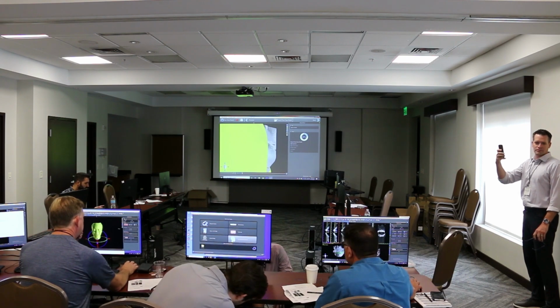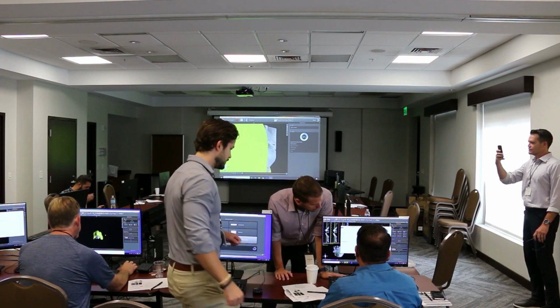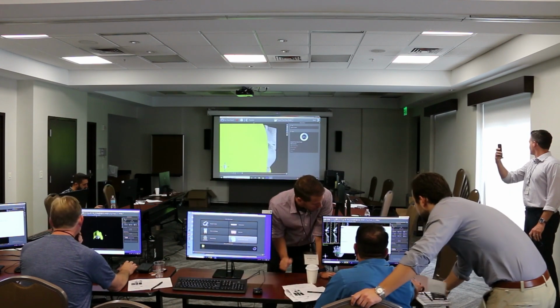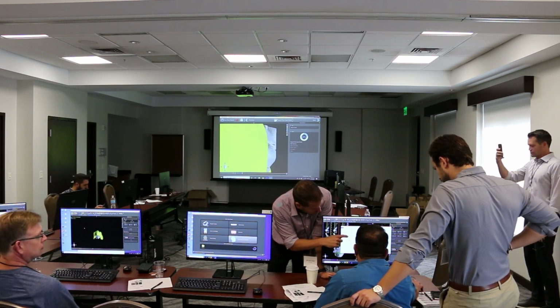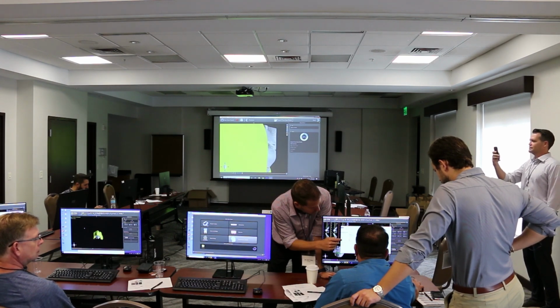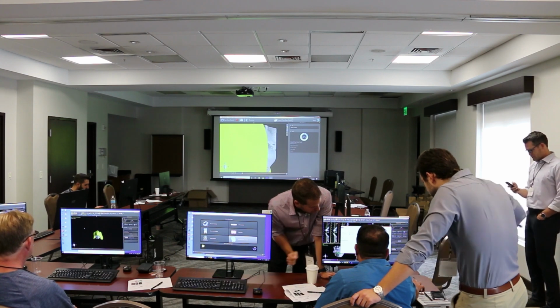Drop this file in Latoya's folder, it should pop right up. Are you just doing a flash drive? Yeah, if you just right click this and hit copy, then go to desktop, then Latoya, double click it, and then right click in there and just hit paste.